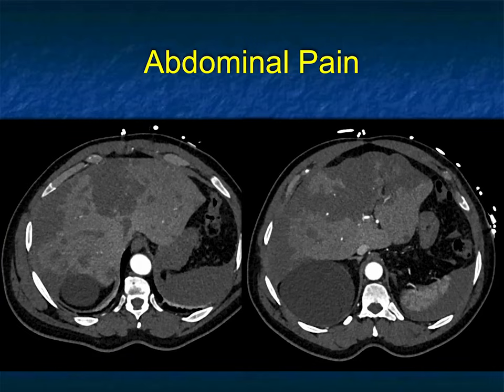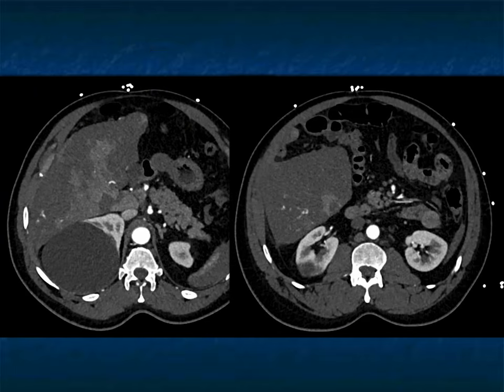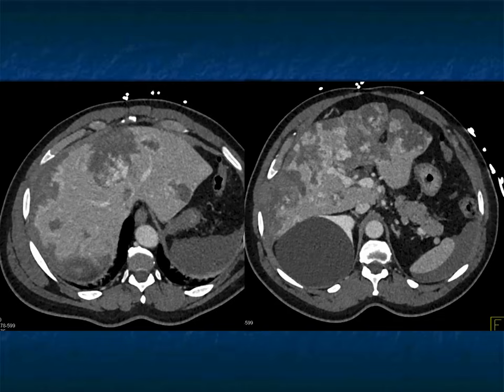Another case, arterial phase, there are infiltrating lesions in the liver. Kind of a funny pattern, almost looks like some of these might be infarcts, but it's involving a substantial portion of the patient's liver. I don't see adenopathy. I think there are textural changes within the liver proper. And then when you go to venous phase, look at all of these vessels.